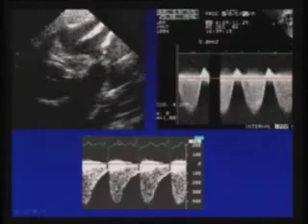And the gradient in the arch, if it is significant, has to be a continuous gradient signal, because in the great vessel we have systolic and diastolic pressures. In ventricular outflow and semilunar valve, we get only the systolic gradient, while with the great vessel we get a continuous gradient, because flow is there from systole to diastole. If it is significant, we get a continuous signal, whether it is pulmonary stenosis, peripheral branch PA stenosis, or coarctation of aorta. Same thing applies there.